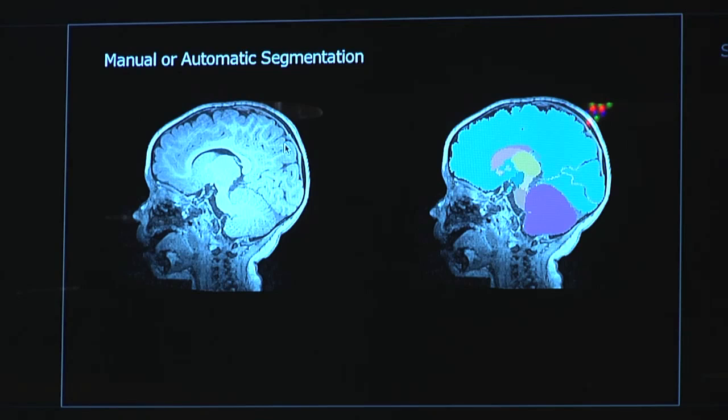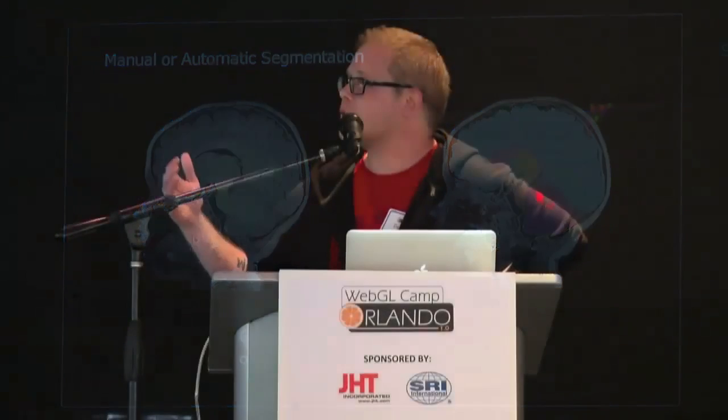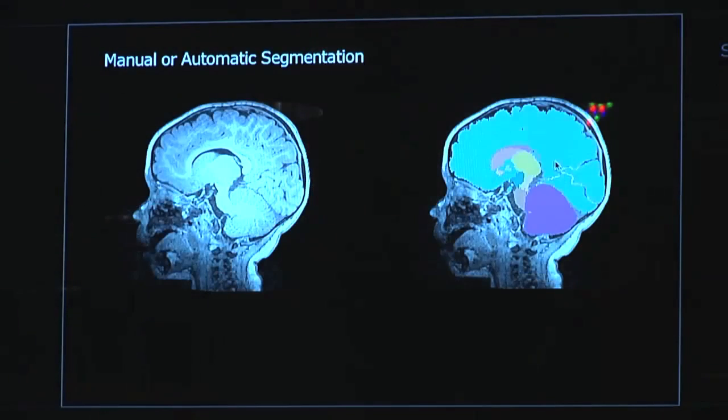So when you have this volume, researchers work on it by segmenting out stuff. And that's a tedious process. Imagine all the slices. A volume has usually 160, 170 slices in the scan direction. To segment means labeling different structures. And so researchers can work like a month on one data set to have it completely labeled when they do it manually. But there are also automatic segmentation methods, which of course, since we're computer guys, we like much more.